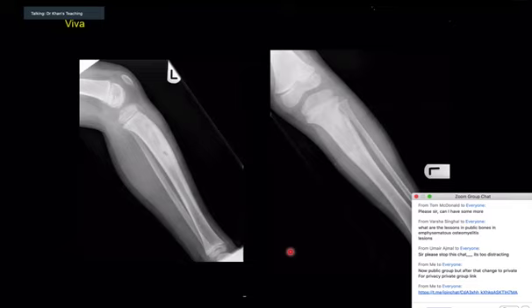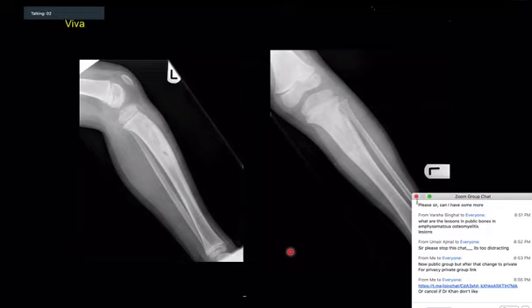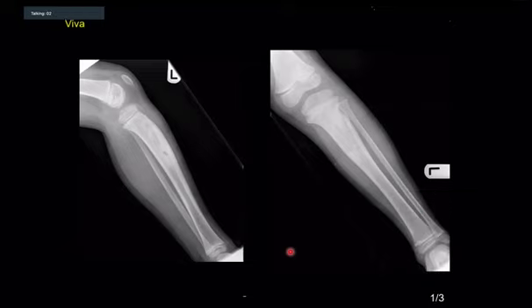So over to you. Okay, so I've got a frontal and lateral radiograph of the lower limb of a skeletally immature patient, because I can see the epiphyses are not fused. And I can see there is a lucency in the proximal diaphysis, on the lateral, with surrounding sclerosis, and the anterior cortical margin is quite thickened.